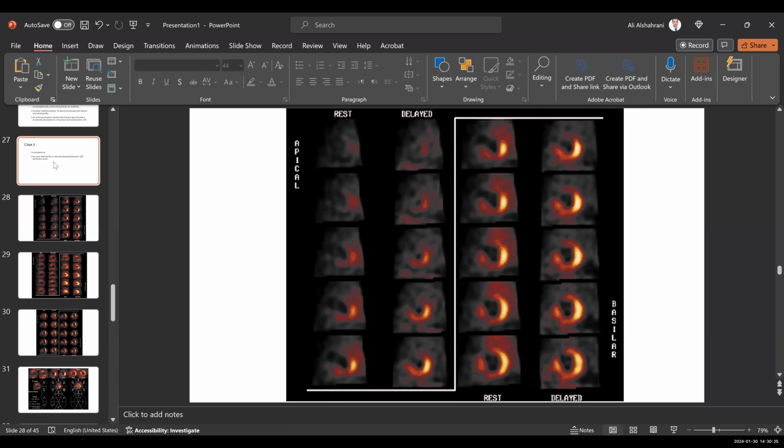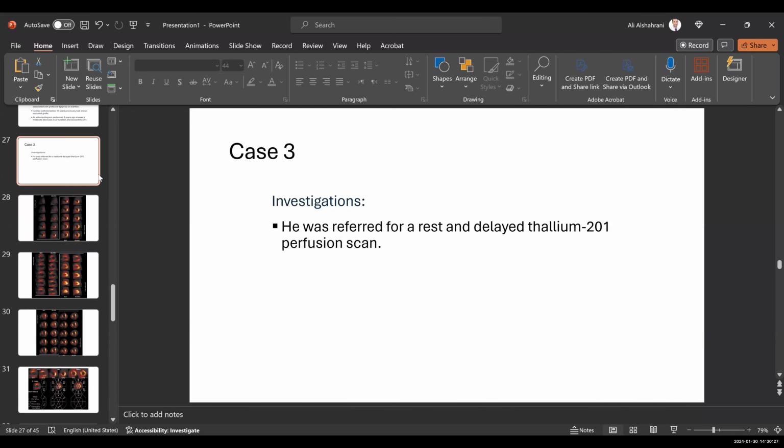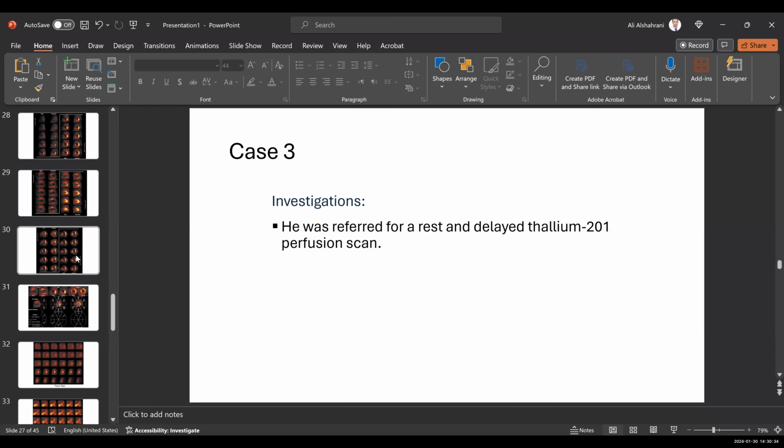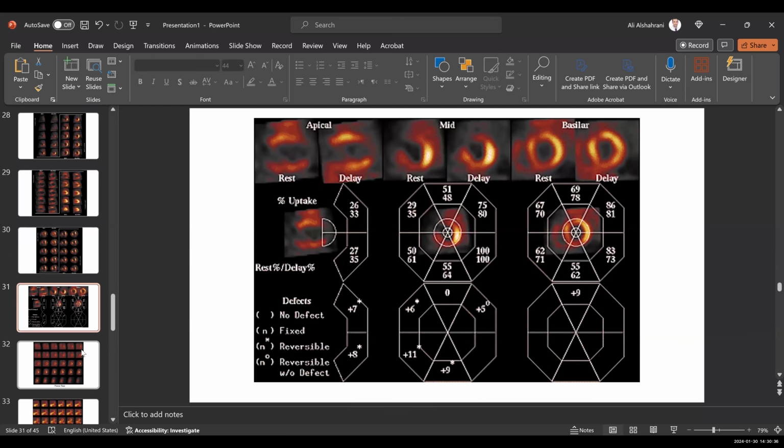as non-viable myocardium, as well as no active ischemia. You can look at this. This is a very fixed defect in the apex as well as septum and the anterior wall. The only preserved perfusion and viability is at the base, anterior lateral, and the entire lateral wall.